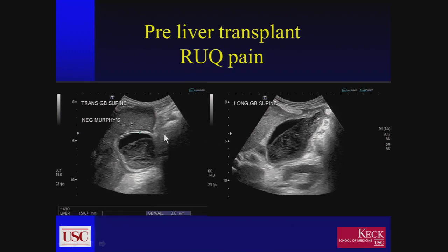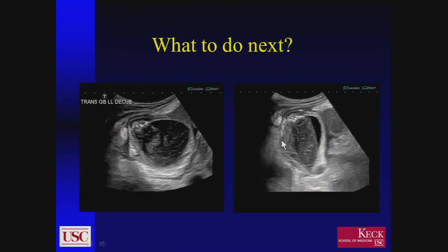And again, thickening of the wall is not an uncommon finding in patients with chronic liver disease. So that really didn't tip us off to saying a whole lot either. But what we did see when we looked very closely at this patient, she has a little bit of pericholecystic fluid, again in a cirrhotic. That's not a very good sign for acute cholecystitis.